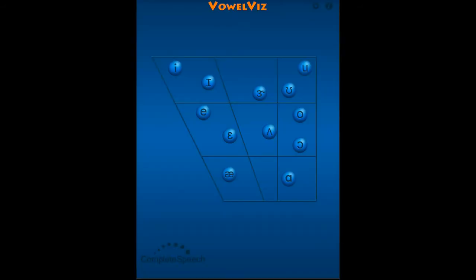When you sit down to help your parent understand how VowelViz works, it's also important to help them understand what they're looking at in regards to spatial differences between vowels and R. Help your parents understand that vocalic R is going to look different depending on the vowel preceding the R. Help them understand that back vowels and front vowels look different, both the correct and incorrect articulations. R, or, ear, air. You can see that back vowels must travel forward and the front vowels have to travel backwards. This will also help your parents and your clients identify misarticulations.